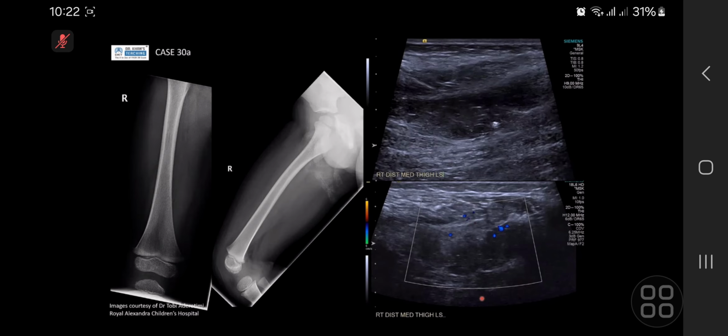So yes, this is not a hemangioma, but this is the other side. They are called vascular malformations. And I'll explain the difference in a bit. So you're right, these are phleboliths, and the reason why I gave the history is that they are usually just dysplastic vessels, okay? It can be lymphatic vessels, it can be venous vessels, normally, or a mixture of venolymphatics.